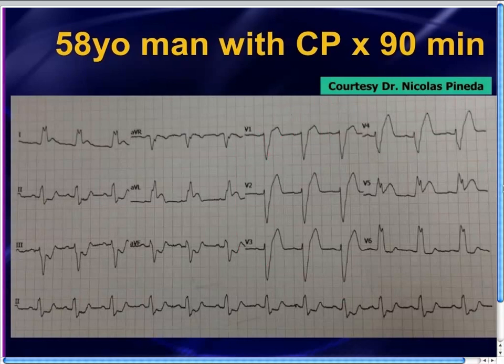Another important finding that you should use to define a left bundle is that a left bundle is such a powerful leftward force, you really should not have any Q waves in those lateral leads. You should just have big R waves, maybe an RS wave, but certainly a big giant R wave without any Q waves in the lateral leads. If you ever see a small Q wave, even a tiny Q wave in those lateral leads, a lot of authors will tell you that that obviates the diagnosis of a left bundle, and you have to call it just a non-specific conduction delay.